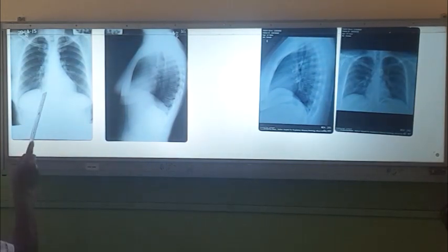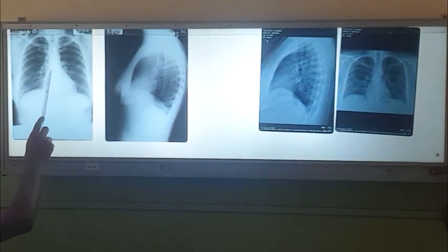For example, next to the right atrium you get air in the right. What is the lobe there? Middle lobe, right? If there is an opacity in the middle lobe, this line will disappear, right? If there is opacity in the lower lobe, this line will be intact and there is an opacity there, right? So this is how you find it. I will show you some examples.